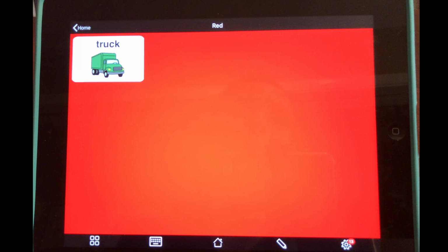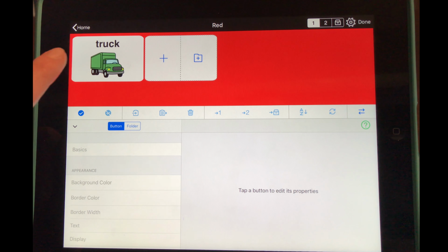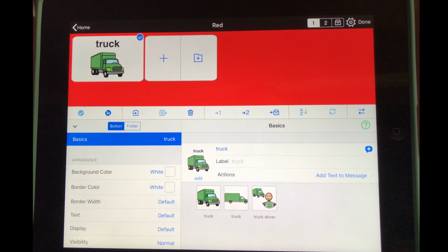Another method that you could employ to teach the child to discriminate that reinforcers are not available on the S delta component is stimulus fading. Proloquo2Go has a couple options for stimulus fading. To do this, you can select the pencil icon down here at the bottom right and select the FCR button which you would like to fade. So you can select this button here.